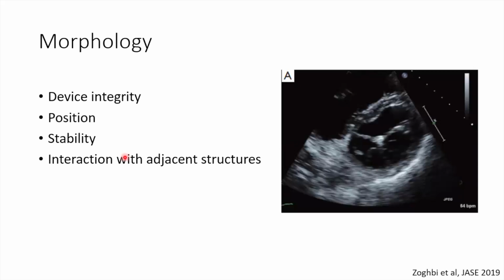So one of the things that's obviously very important is to look at the morphology of the valve, to look at the device integrity. So what is the position of the device? Is it where they had intended to put the device? What is the stability?